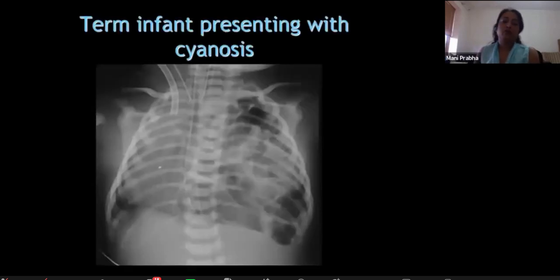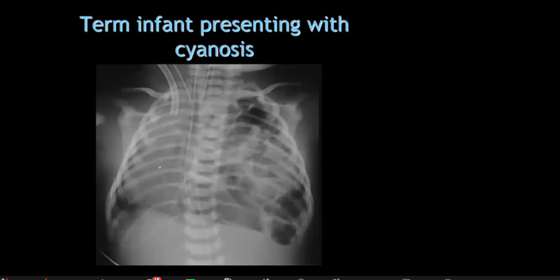So this is the next one for you, and then I'm going to sum up all the findings. This is a frontal chest radiograph of a term neonate. Just in terms of tubes and lines, there is an appropriately sited endotracheal tube. There is an NG tube, which I can see passing just below the diaphragm, terminating around the level of the left pedicle of L1. And there is an umbilical catheter, although without the abdomen, I can't see where that goes, as well as a right internal jugular line.